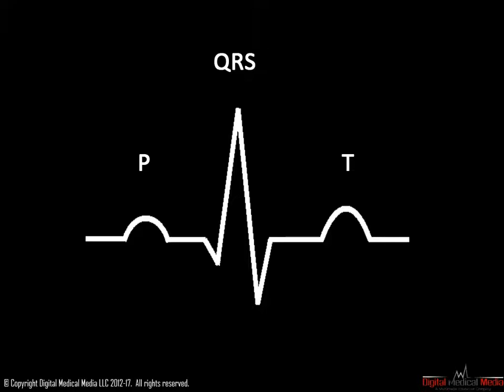Repolarization of the atria does occur, but cannot be seen on the ECG tracing because the atrial tissue is too small and additionally is covered up in time by the presence of the QRS, which is a much larger signal. The QRS wave represents depolarization of the ventricles and is therefore phases 0, 1, and 2 of the action potential curve. The T wave, which is repolarization of the ventricles, is represented as phase 3 on the action potential curve.